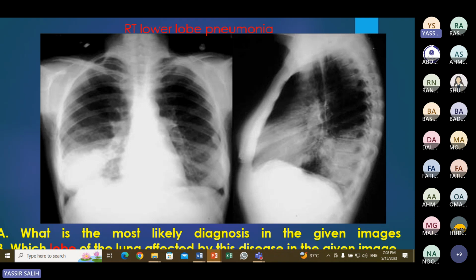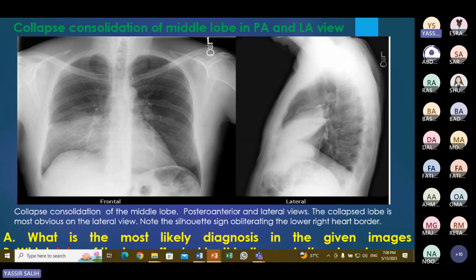Yes, the diaphragm. What about the diaphragm? That it becomes elevated or continuous. An elevated diaphragm is when something is pushing it from below. No, I mean that they appear in the same color. Now, on this chest X-ray, do you see the right hemidiaphragm or the right dome of diaphragm clearly from the costophrenic angle to the cardiophrenic angle? Do you see all the right hemidiaphragm clearly and sharply in this one?